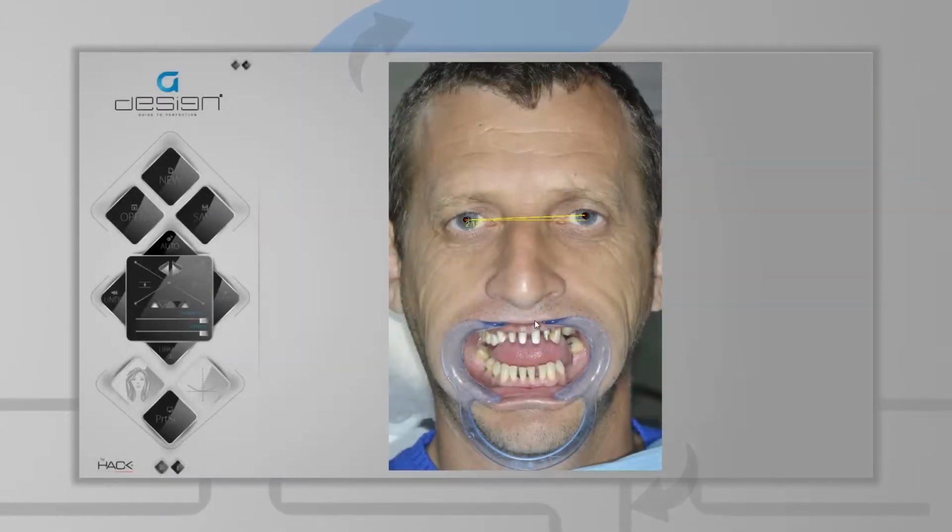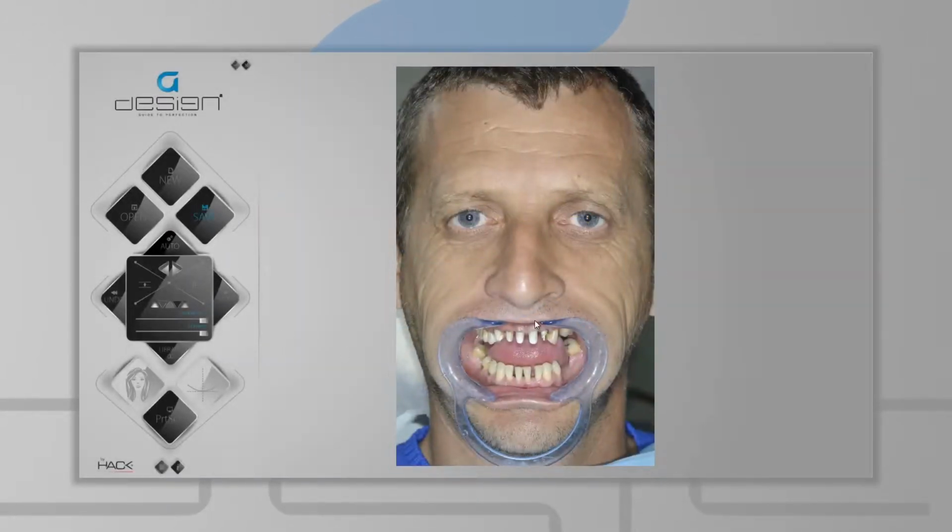After the pupil marks are set, the application will automatically rotate the image so that the line between the two marks is perfectly horizontal, and will then highlight the facial axes, the incisal edge, and the guiding lines. All these axes can be set manually, depending on the case, for rendering the information needed in the perfect design.